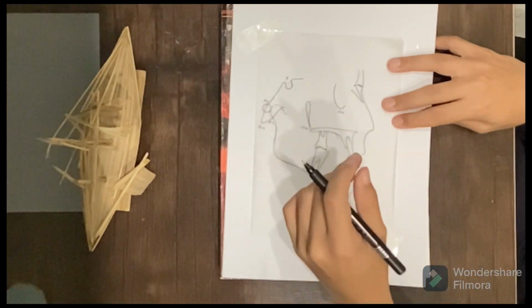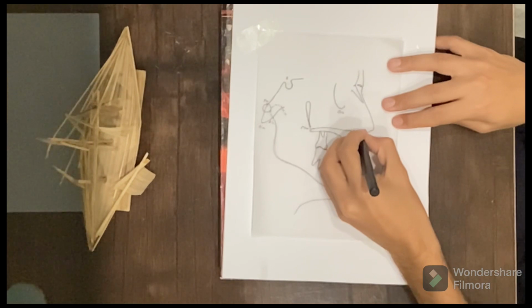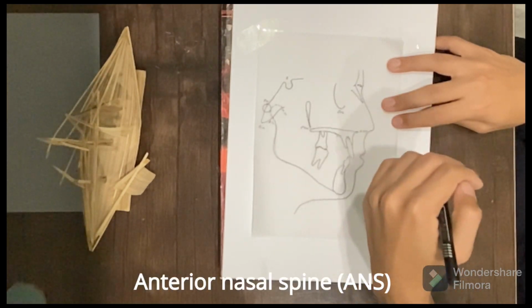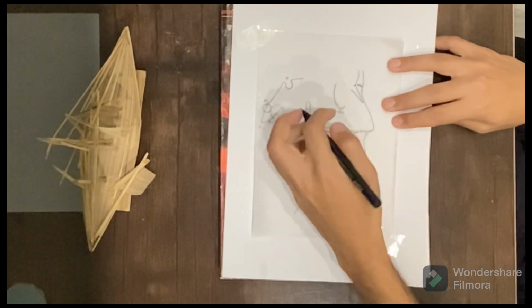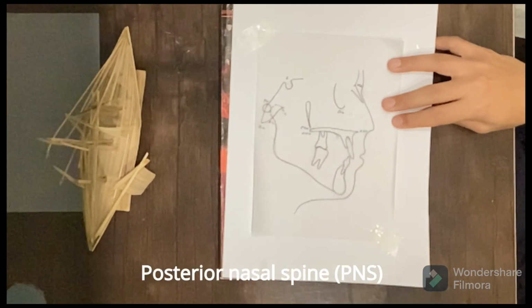Now coming to the nasomaxillary complex. The nasomaxillary complex has unilateral points, which are the anterior nasal spine. Anterior nasal spine is basically the anterior projection of the hard palate and nasal floor, and its posterior projection is called the posterior nasal spine, PNS.